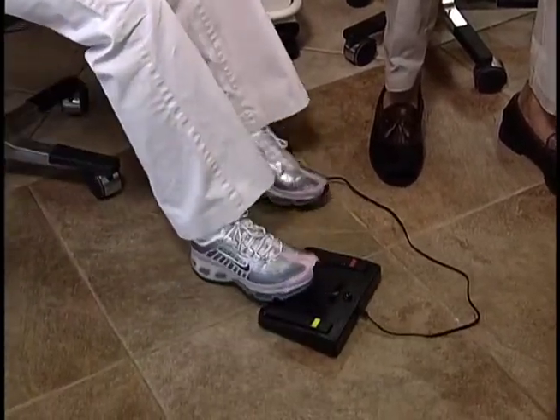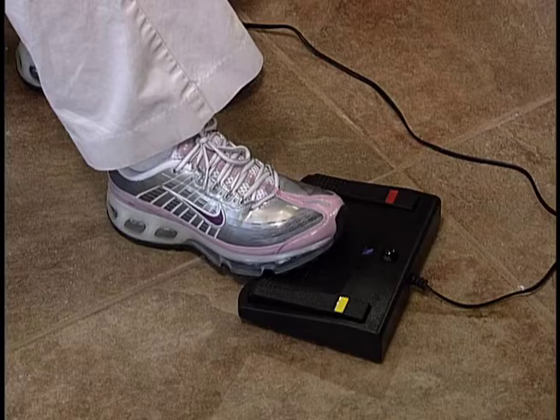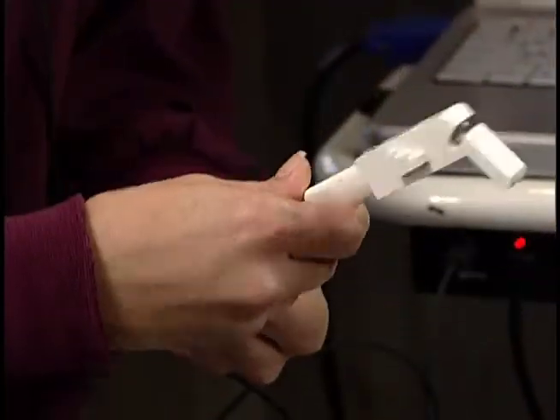Now think about how you work around the chair. Are you right or left footed? What foot do you use for your rheostat? I'll use my right. And when we watch you work, we'll offer you. It depends on where the computer is, where the chair is, whether you're right or left-handed. Okay? Go ahead and install it on the encoder cable.